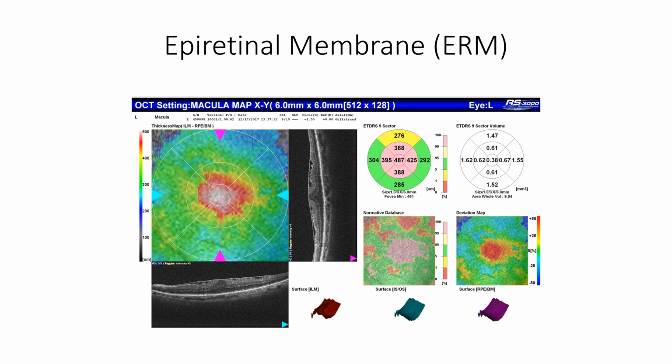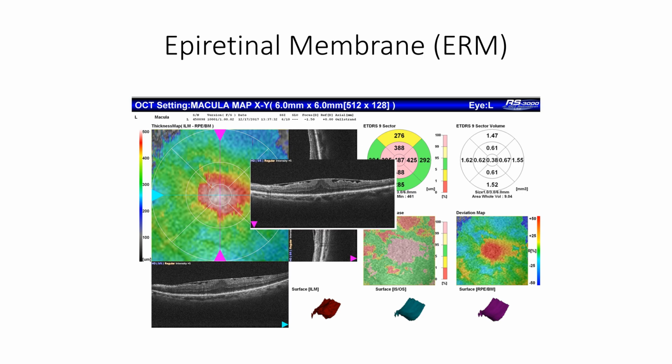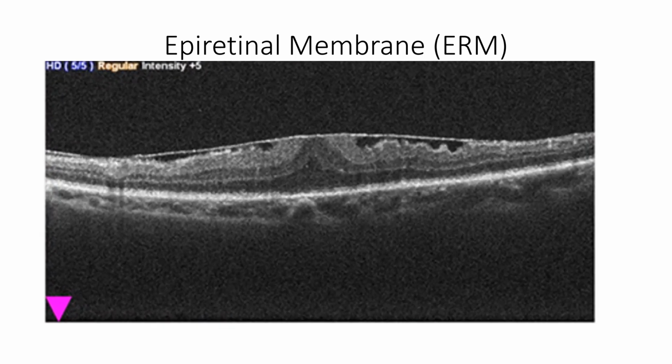So if you have a cortical vitreous adhering to the posterior pole, it can give rise to epiretinal membrane. And here we have that situation. We can see the epiretinal membrane attached as a sharp hyperreflective line on the retinal surface at the posterior pole, and at places it is slightly detached from the underlying neurosensory retinal surface, and wherever it is adhered, it has pulled the retina up.